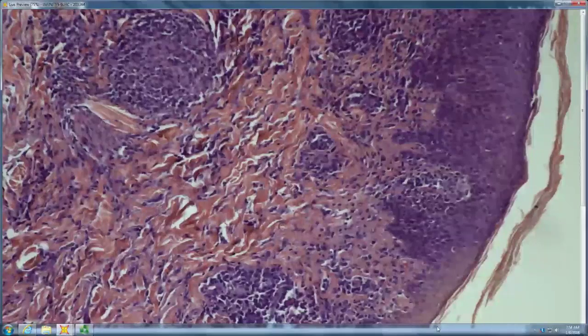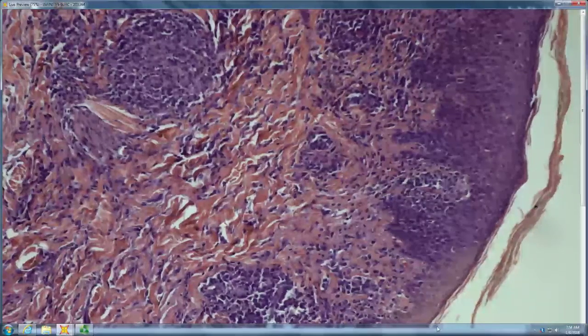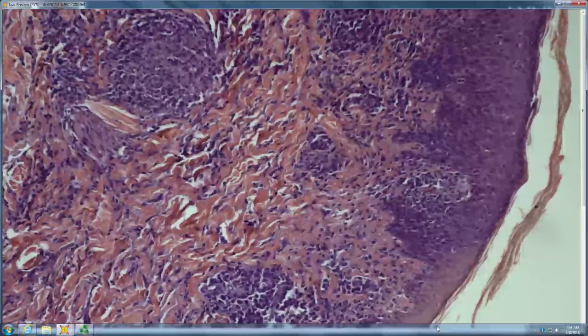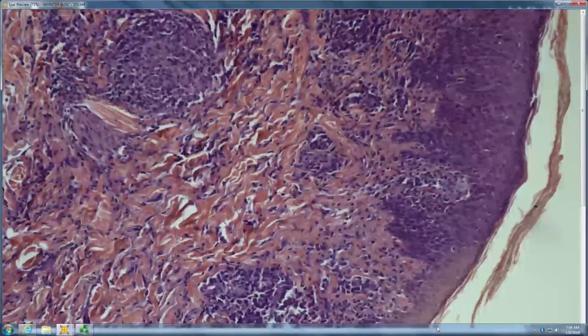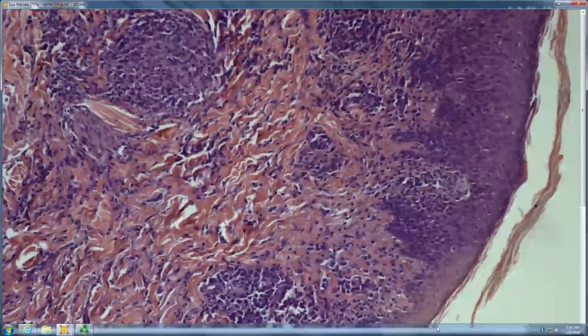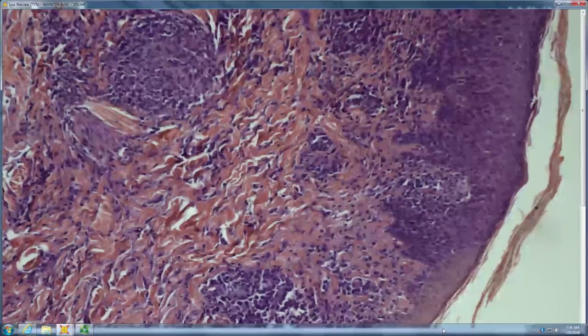Atypical mycobacterium, fungal. For interface plus granulomatous? Oh, drug, viral, syphilis. Yeah, exactly. So drug and syphilis are probably at the top. This one happens to have lots of plasma cells and an interstitial busy dermis, all of which are syphilis features, which is what that one was.